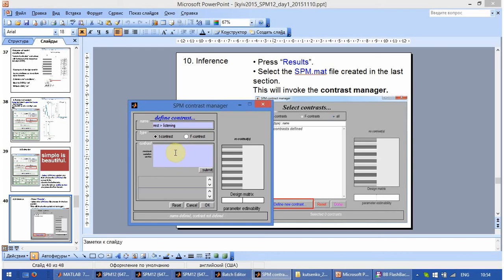So that we are able to identify such areas, we enter contrast -1. We click submit. Now we see the gray bar turned downwards at the top of the condition of interest.